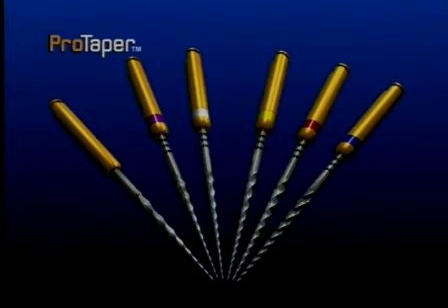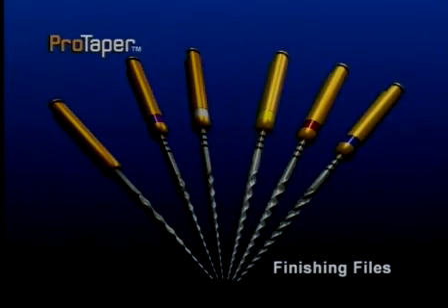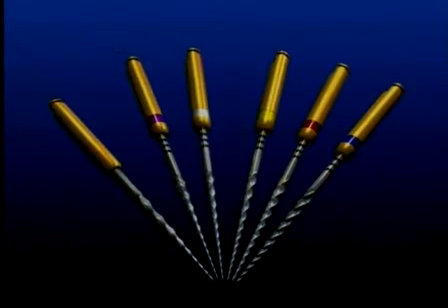The new ProTaper instruments represent a revolutionary progression in root canal preparation procedures. The basic series is comprised of 3 shaping and 3 finishing instruments. Let's look at the shaping files.